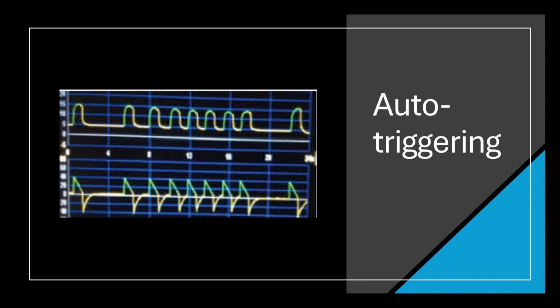So the treatment is to look for an air leak in the circuit and a condensation issue. This has to be looked for and treated. And here sometimes you can adjust the trigger. So flow trigger or pressure trigger, you have to basically increase the trigger so that the sensitivity of the ventilator will decrease. So you have to adjust the trigger.